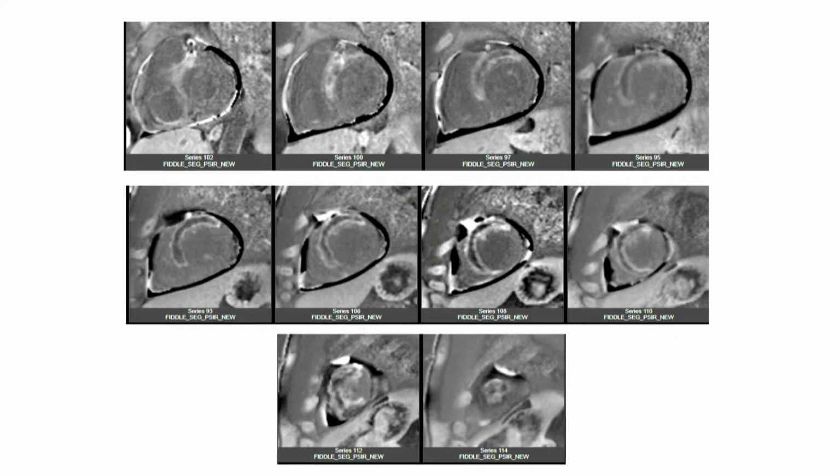Yeah. So when you see this, the big thing you need to be able to distinguish is, could this actually be a thrombus that's layered on top of the myocardial wall, in which case, when you look at the cine images, you can't really appreciate what looks like a thrombus because it's a layered thrombus, right? And the key distinction between identifying microvascular obstruction versus a layered thrombus is two key things you look for. One is that microvascular obstruction has to be surrounded in 3D space by hyperenhancement, whereas a thrombus is not. Correct.